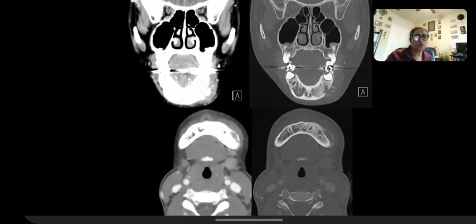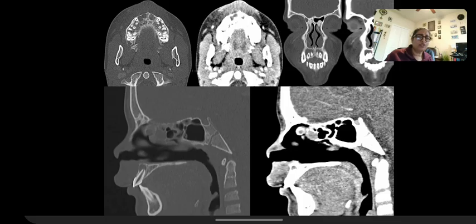This patient also has that soft tissue swelling in the buccal space, and you can see that periosteal reaction very nicely on the axial images, as well as the sclerotic changes in the mandible from osteomyelitis. Okay. That's one. This is another example of a kid who had infected teeth. So you can see there are periapical lucencies involving the central and lateral maxillary incisors. You can see there's a subtle thinning of the buccal cortex of the right maxillary alveolus.